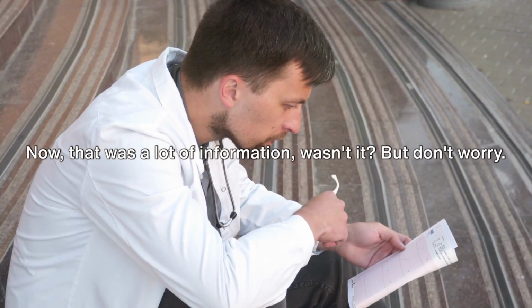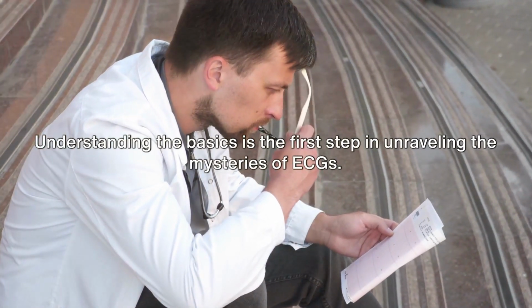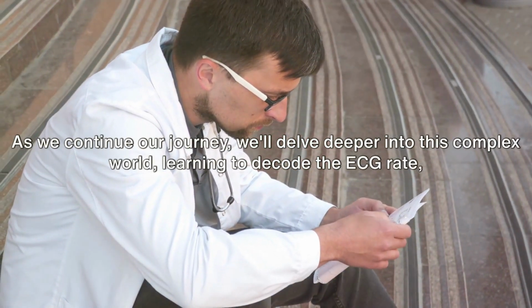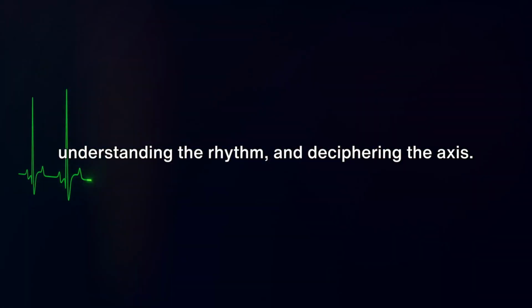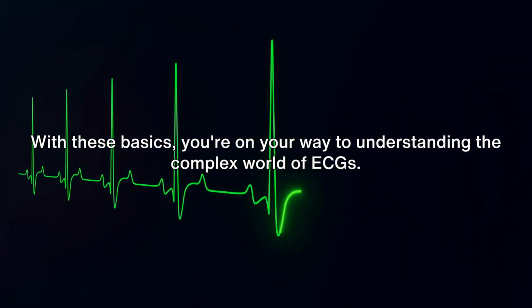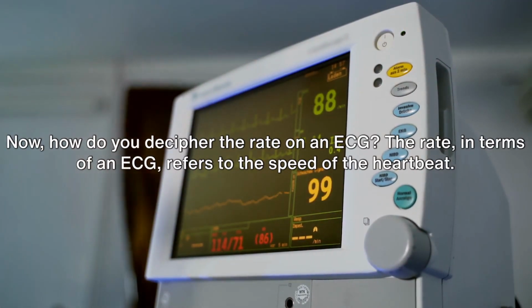Now that was a lot of information, wasn't it? But don't worry, understanding the basics is the first step in unraveling the mysteries of ECGs. As we continue our journey, we'll delve deeper into this complex world, learning to decode the ECG rate, understanding the rhythm, and deciphering the axis. With these basics, you're on your way to understanding the complex world of ECGs. Now, how do you decipher the rate on an ECG?